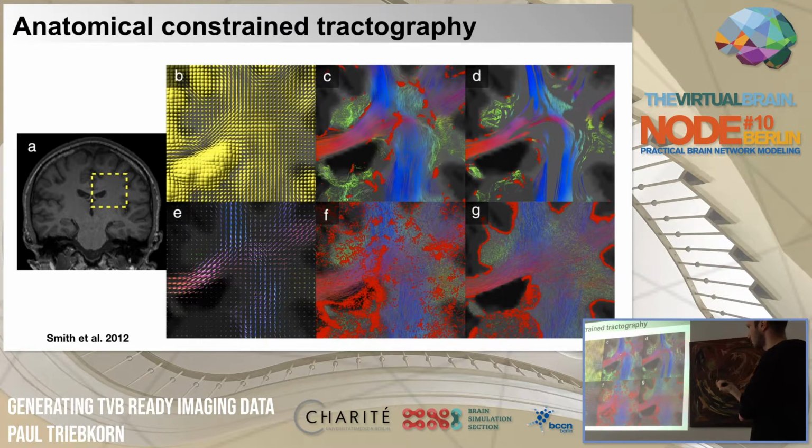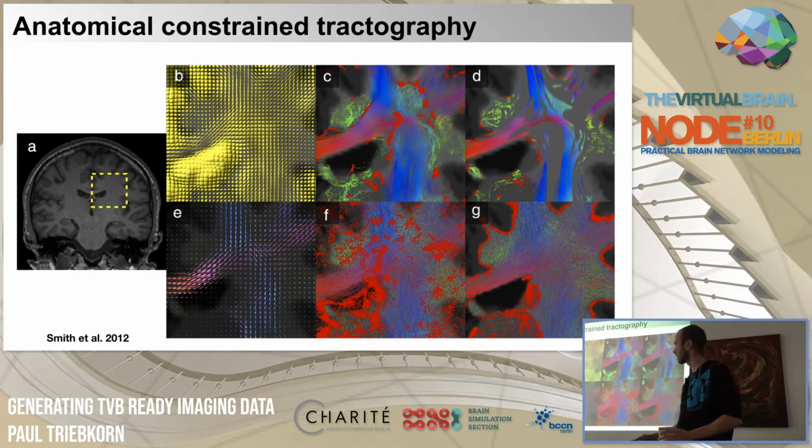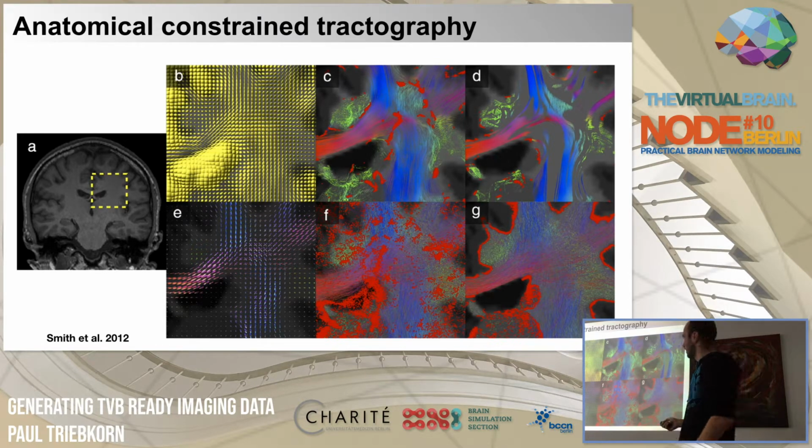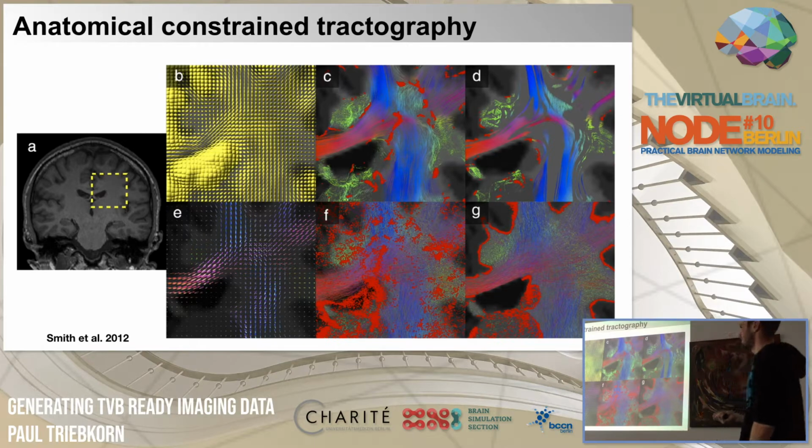So these are not plausible, but these holes in here are also not plausible, because there would actually be fibers. And why do they end here? I said they're doing an unnatural curvature of the streamline in this step. This is caused by the fact that here they're crossing streamlines, and this technique isn't able to identify this crossing of the streamlines.